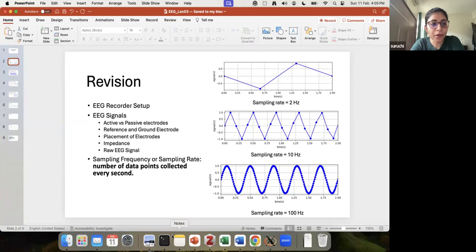Okay. So today we are going to do more practical. Briefly, what we discussed last time was the EEG recorder setup. And we also did a practical in IIT Delhi. Vicky, do you have any question on that? You were asking me something on RNet, right?